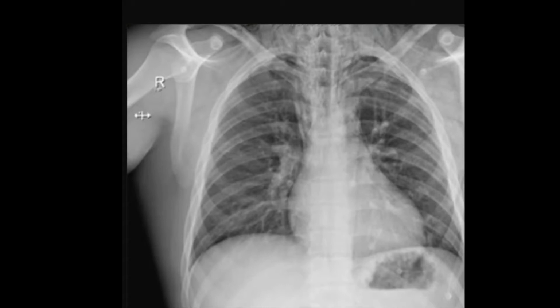So this was our first case, chest radiograph, and here we can see an example of pneumomediastinum. We can see these linear lucencies extending along the contour of the mediastinum and into the neck, especially at the base of the neck over here. The heart is normal in size. There's no evidence of pneumopericardium. We don't see a continuous diaphragm sign. We don't see a pneumothorax.